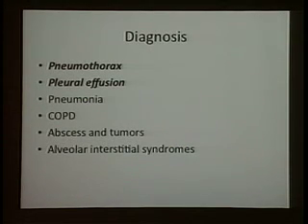So what is it that we want to gain when we do lung and pleural ultrasound? Basically, you want to make the same principle. Big diagnoses here: we're talking about a pneumothorax, a pleural effusion. If you push it a little bit more, you can look at volume status of the lung, the amount of water in the lung. I'm going to show you some images there.